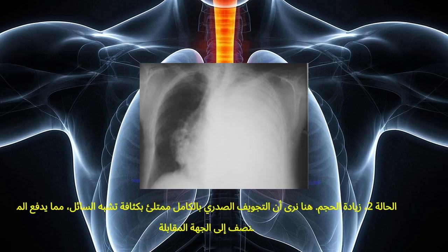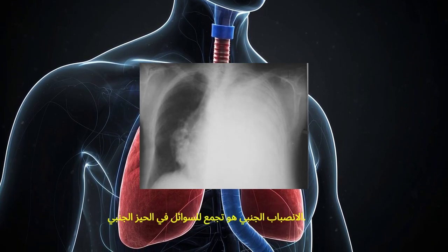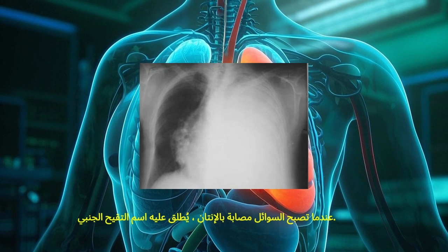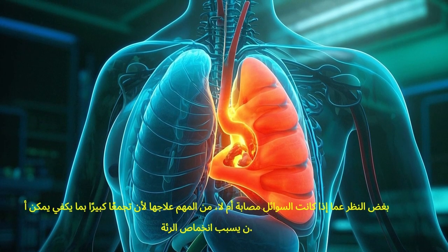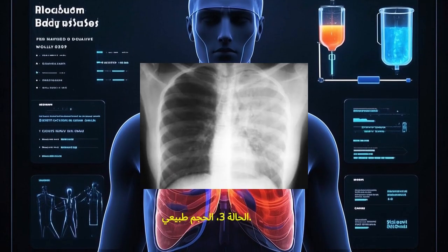Case 2. Increased volume. Here we see the entire thoracic cavity is filled with a fluid-like density, pushing the mediastinum to the opposite side. This finding is concerning for pleural effusion or empyema. Pleural effusion is a collection of fluid in the pleural space. When the fluid becomes infected, it's called empyema. Regardless of whether the fluid is infected or not, it's important to treat because a large enough collection can cause a lung to collapse.